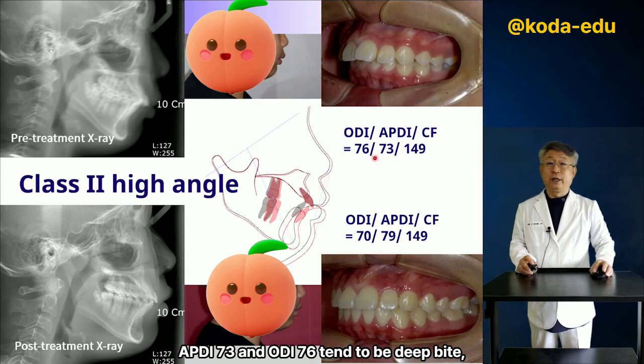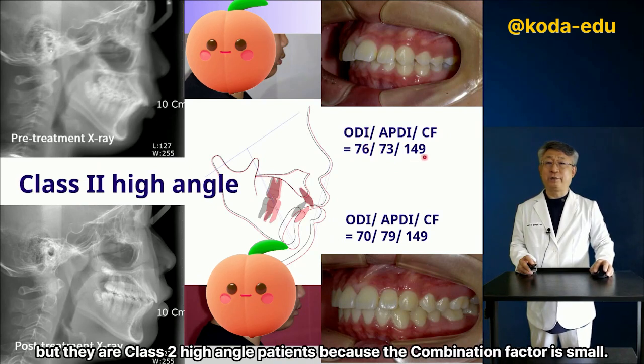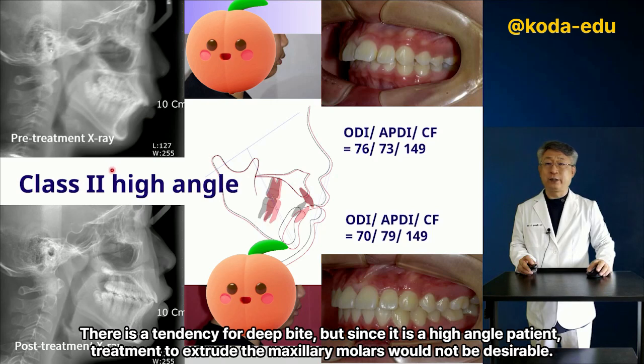APDI 73 and ODI 76 tend to be deep bite. But they are class 2 high angle patients because the combination factor is small. There is a tendency for deep bite, but since it is a high angle patient, treatment to extrude the maxillary molars would not be desirable.